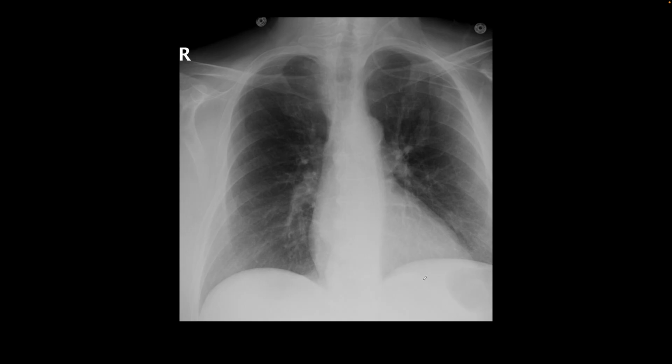Here's our next patient, and this is a great example of a malpositioned central venous catheter. A left-sided internal jugular venous catheter was placed, and we see that the tip, instead of going this way into the SVC, and the tip normally should be at the level of the cavoatrial junction right there, it has gone to the other side, probably in the subclavian vein or in the soft tissues. So if you see something like this, please let them know immediately to remove this and replace the catheter.